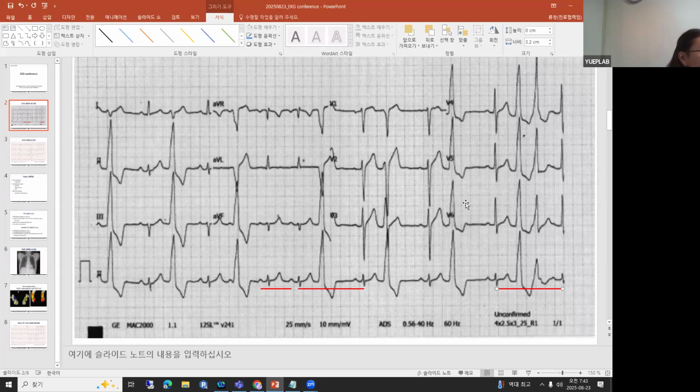If your P wave falls inside the QRS, yeah, it's a long PR. So that's a possibility we cannot exclude. So there are two distinctive possibilities here that you need to think about. Maybe that's one of the reasons the QRS looks a little bit narrowish. This guy here is a little bit narrower than that. So the intrinsic deflection time is slow.